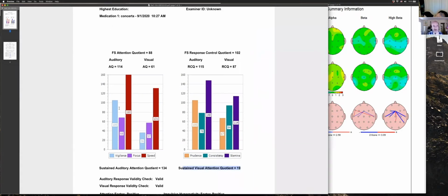Once people are performing pretty well, what you see is flat bars, 3 bars that are even across the tips, all 4 sets. So it's the inefficiency I'm concerned about, not any big or low scores. You want to see 3 bars there, and 3 bars there, and 3 bars there, and 3 bars there, not something pushed up and something dragged down. You'll probably come up above average, but right now you're using lots of effort to do it. You should be able to perform this well with no effort.